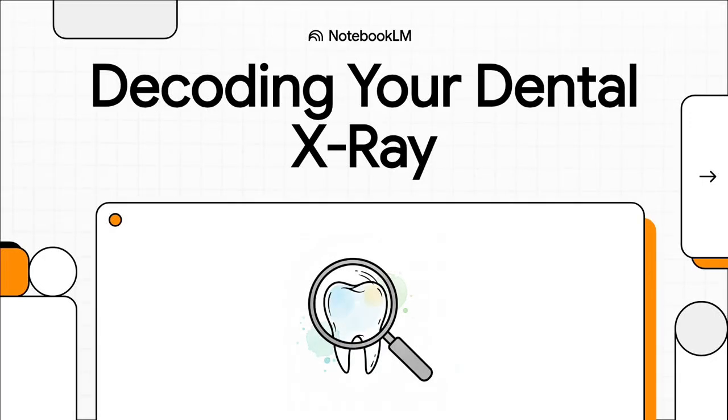Have you ever sat in the dentist chair, stared at your own x-ray, and just nodded along? You have no clue what you're looking at, but you pretend you do. Well, not anymore. Today, we're going on a decoding mission. We're going to learn the language of that image and understand the story it's telling.